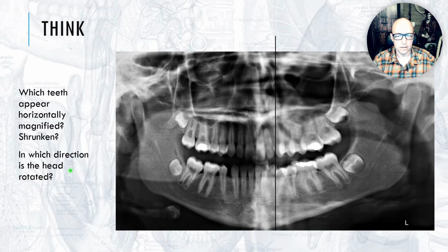Hopefully that makes sense. It does get a little tricky because you can have head rotation with the anterior teeth still right in the center. So imagine this is the center and I can still rotate my head. And then if you pay attention to the back, so this we said was rotated right. But if I had my midline lined up correctly, where that's right in the center, and I rotate my head to the right, look at my back teeth.